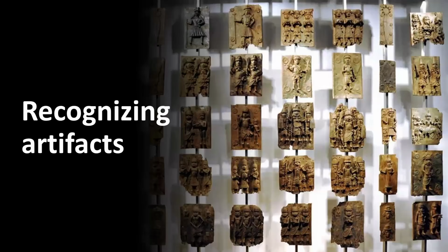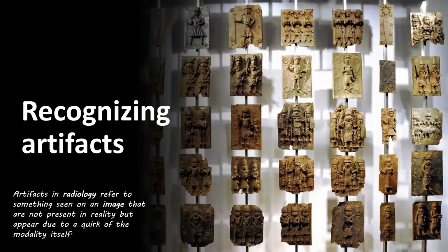Now, a final word, and also very important, is recognizing artifacts. Artifacts are very frequent, and what do we mean when talking about artifacts in radiology? It's basically something you see on an image that is not real. It's not present in the patient. It's created by the software or by an error during the making of the scan. So it's basically a false image.